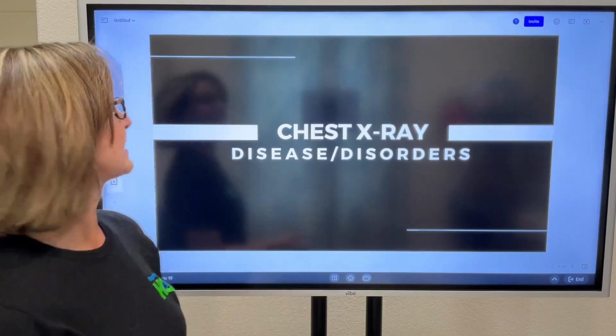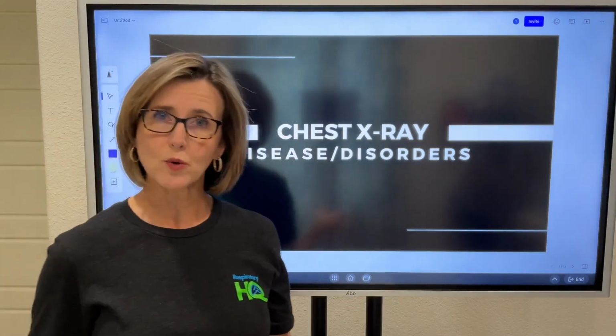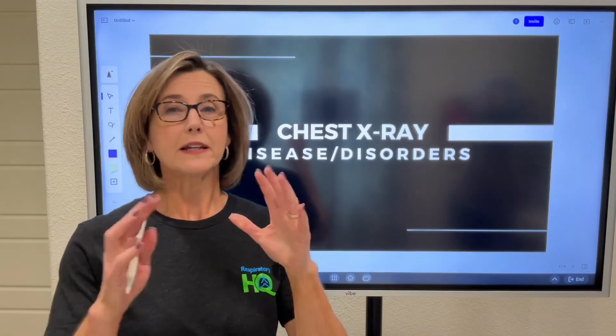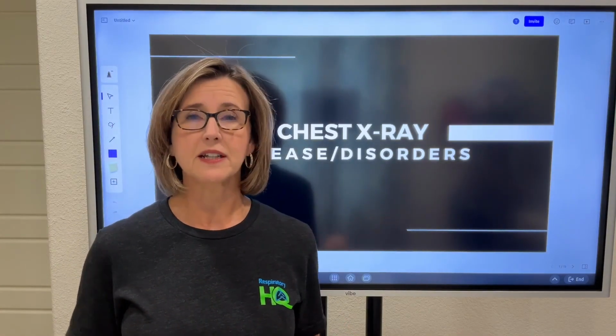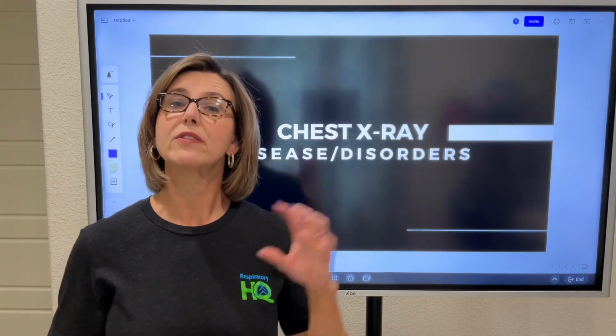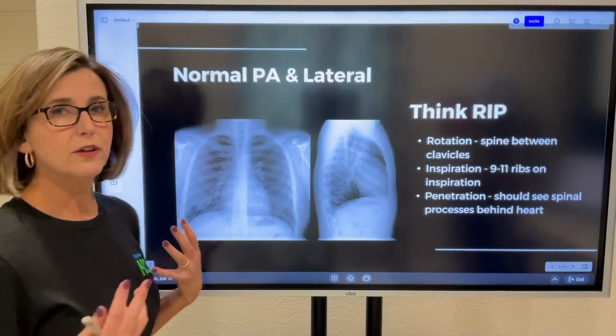So here it is. We're going to talk about chest x-rays for diseases and disorders that the NBRC credentialing exam likes to test on. Now, I'm not teaching the disease process. This is a drilled down version of what you need to know about the x-rays, okay? So let's start with normal.